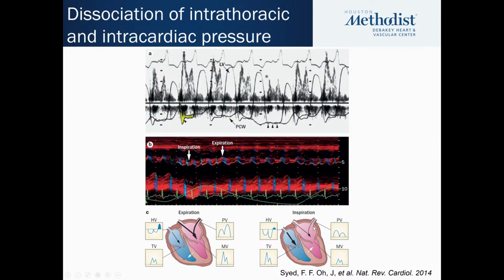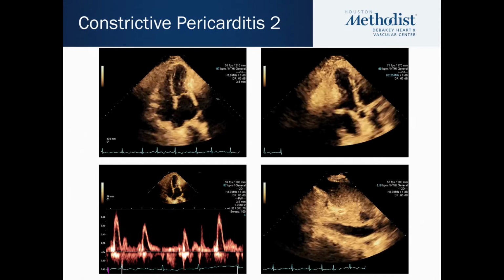Flow into the LA from the pulmonary vein decreases, the septum is shifted to the left, and the RV receives more flow at the expense of the LV. As the patient expires, flow improves back into the left ventricle. The mitral inflow increases in velocity, and the pattern changes, as you can see. And you see how the pulmonary vein changes are discordant to that. The septum moves back, and the hepatic veins show you this reversal, because now it's the RV that's struggling to receive more blood.